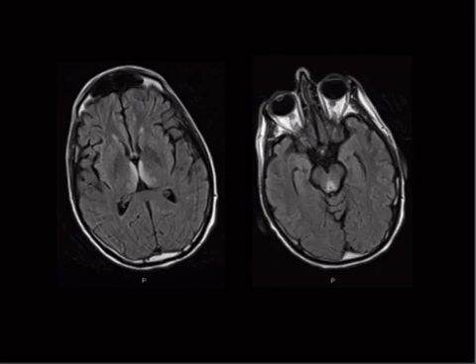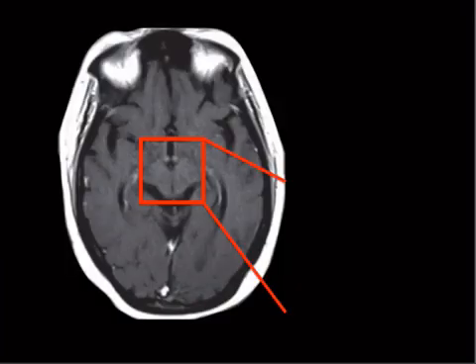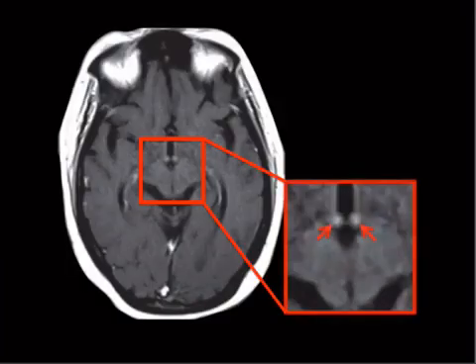All right, next case. So this is a classic thing. You need to know this. So right here, central thalamus too on FLAIR. But the most specific or most useful thing that they can show is actually this case right here. So we've got a nice zoom in. Strong uniform enhancement of the mammillary bodies is seen in up to 80% of the cases and considered pathognomonic.